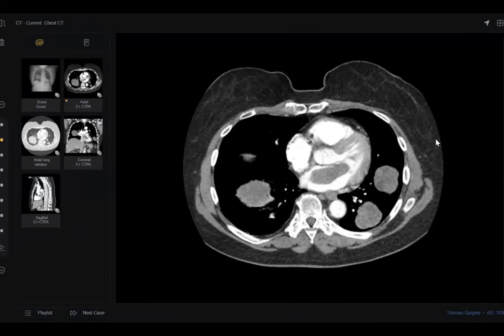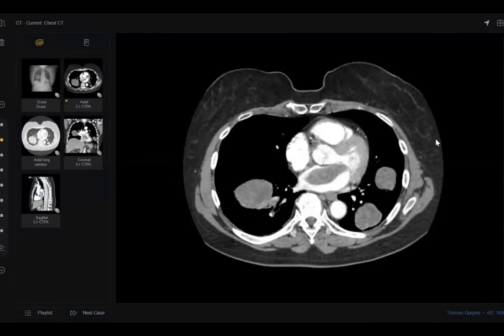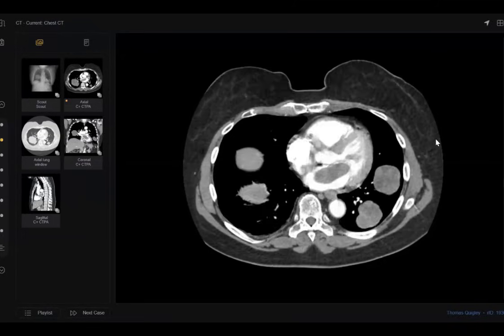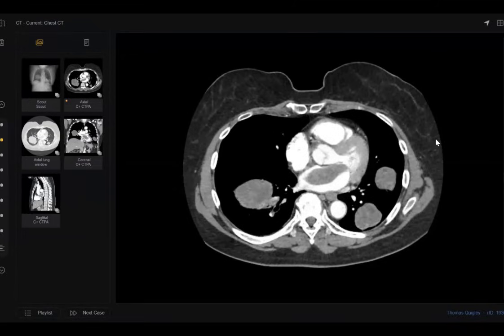This mass. I thought it is extending from the lung mass, and this is tumor thrombus. However, other possibilities include a cardiac mass. Okay. Is this something urgent to be told to the clinician or to be discussed in MDT?